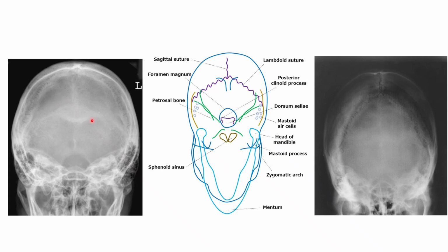Now we go a step further. Knowing that we see the occipital bones here clearly, we want to make sure that we've flexed the chin enough or used sufficient angulation, that our imaging technique was just right, that all of our factors were book perfect, the way that I just described it.